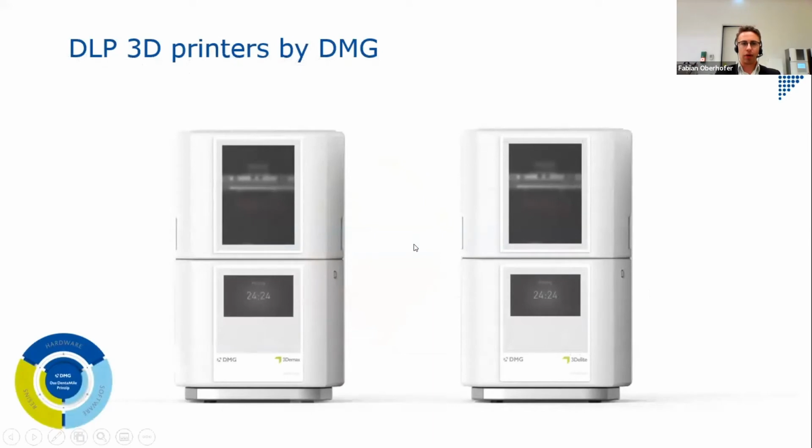So these are our 3D printers. This is our hardware, which is one part of our DentaMile principle. You will see this visual a few times more in this presentation, so you can always recognize it as part of the DentaMile principle.